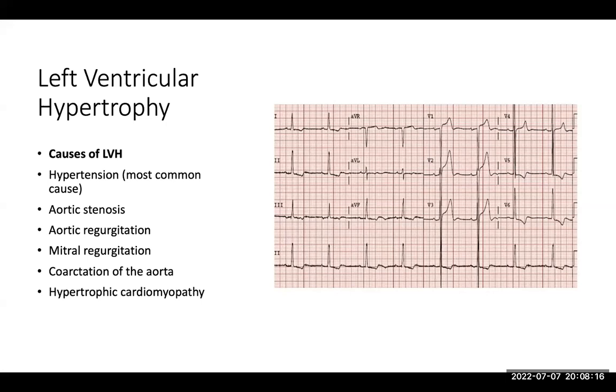The common one, which is usually used, is what I'll share with you because of time. And that's the thing you really need to look very critically at in this ECG, so that when you have this kind of ECG in front of you, you can diagnose LVH very, very easily. The most common one which is used is called Sokolov criteria. You don't need to know the name, but that's the commonest one.